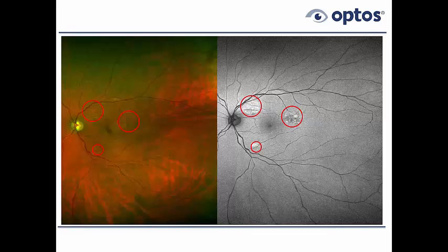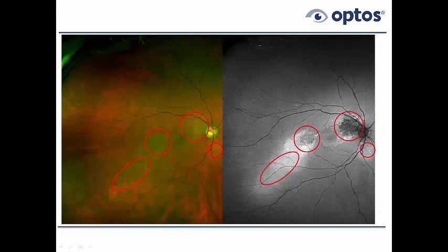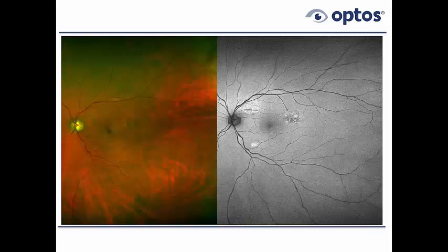But central serous is certainly not a rare disorder, and it's really not central. For example, in this left eye, we can see there's nothing going on in the macula. And in the right eye, there's a subtle abnormality in the macula and a lot of lesions which are outside the macula. So it may be misnamed, and sometimes you find these changes really extensive in the retina. And it's an important condition to know about for differential diagnosis. Some treatment options are available for these patients, but usually it's sort of judicious neglect and we do nothing. We just follow the patient, and the patients get better by themselves in most cases.